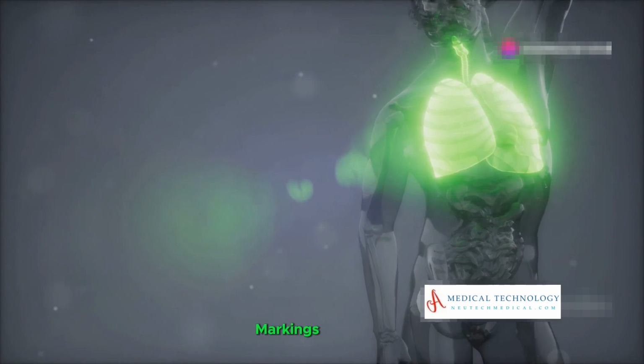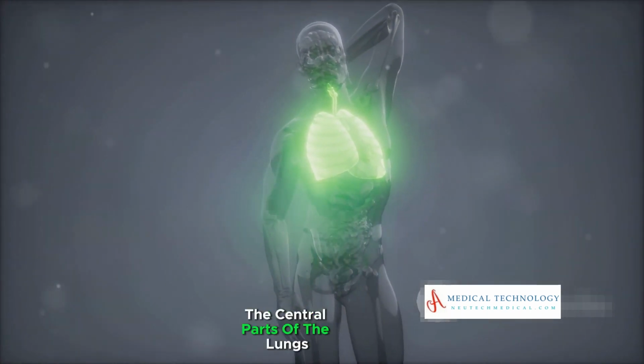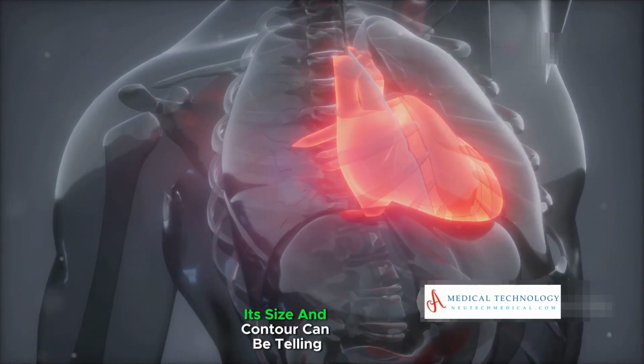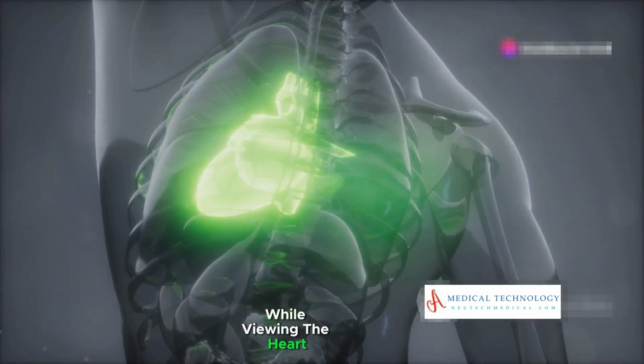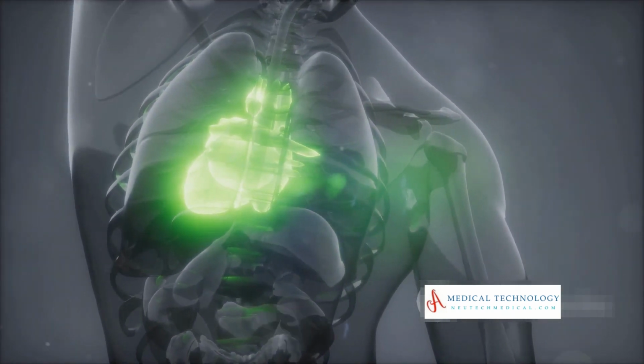Evaluate the vascular markings. They should become less prominent as you move from the hila, the central parts of the lungs, to the periphery. The heart comes next. Its size and contour can be telling. A normal heart should not occupy more than half the width of the chest. While viewing the heart, also note the position and clarity of the diaphragm, which should curve neatly along the bottom of the heart.